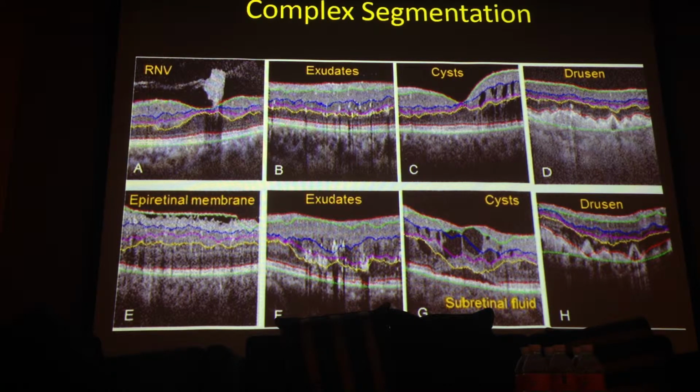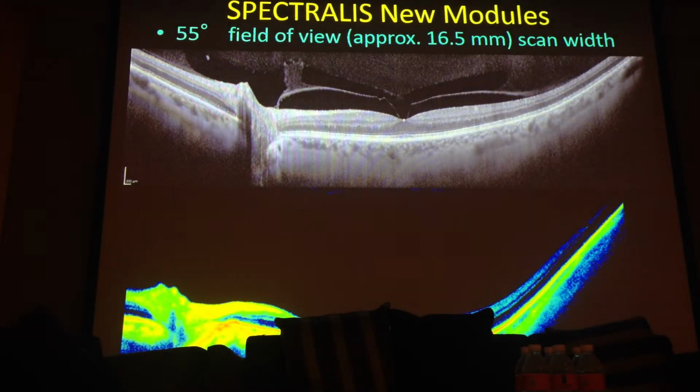But when we have disruption and something like a cyst, it's very difficult. You have seen this morning a few images. There was a discussion: we don't know if we have a reduction of vascularization or we are measuring a cyst. So using this kind of software with the help of the doctor, probably the machine will be more powerful. And please don't trust every image you see if you don't know how the image has been built. Another evolution of the OCTs will be to enlarge the line of acquisition.